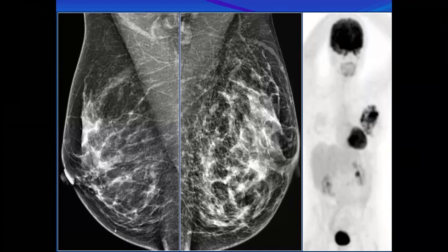Let me ask you one question. If you have an enlarged breast with global asymmetry, and if you have a small breast, where the breast associated with global asymmetry is smaller compared to the contralateral breast, which one can you make suspicious? You can report it as suspicious, or you will raise the suspicion: the enlarged breast or the smaller breast?